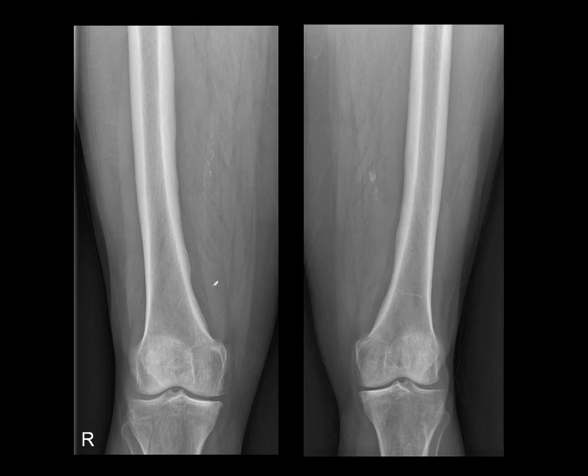So what you'll see is a rather benign looking thin periosteal reaction, and there's an area of lucency just under there, if you can see that. This is the classic appearance of HPOA, and that's associated with a large number of underlying conditions: Crohn's disease, cirrhosis, bronchiectasis, cystic fibrosis, but the one, of course, that people are always concerned about is a primary bronchogenic malignancy.